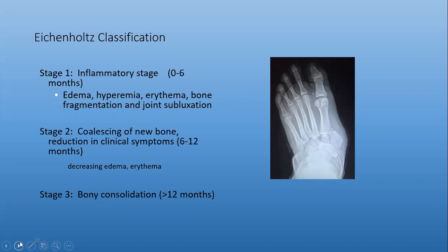Yep. Awesome. Okay. So I see an AP view of the left foot. What's most striking is there's a lateral angular deviation of the foot at the tarsometatarsal joint and more distal to that, as well as debris and destruction of the navicular.